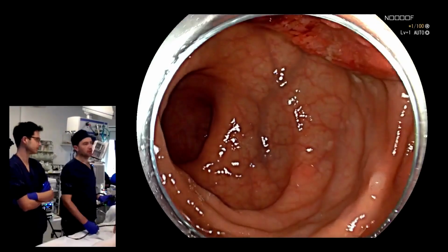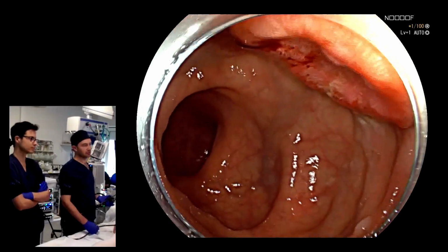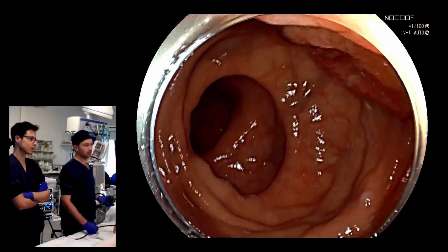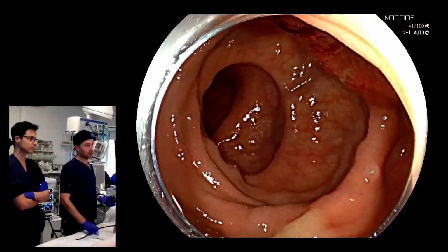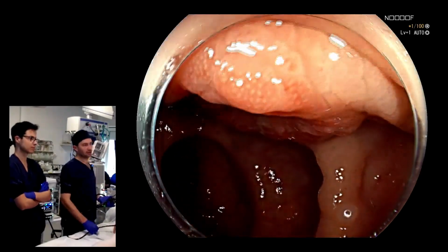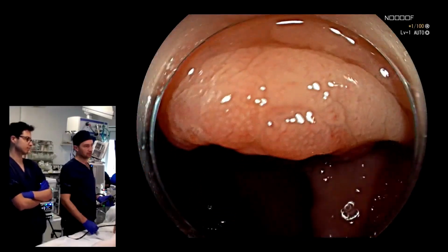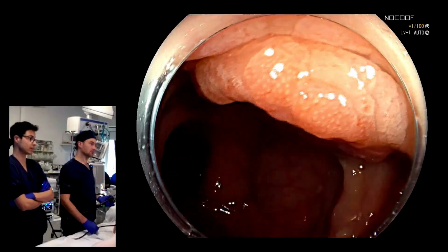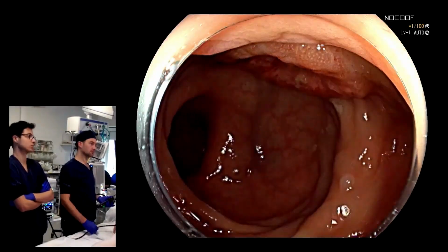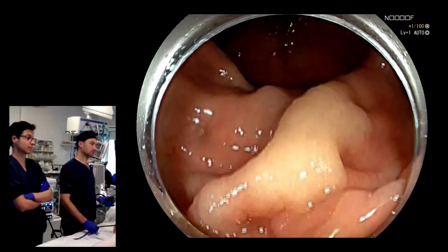Okay, but anyway, let's take a step back. So you talked about an overview. We've done that. I've given my opinion. What's the next move? Say that you're someone who's not an expert. You want to provide as much information about this to a multidisciplinary meeting as possible. So think of the BLINK features of cancer. Use them as a checklist. So you think of them, and you evaluate their presence in the lesion.